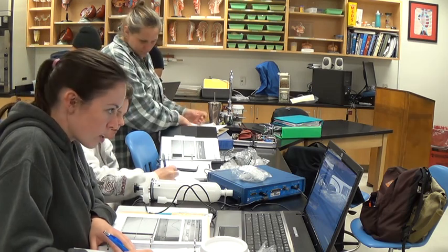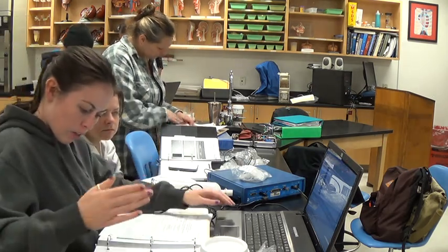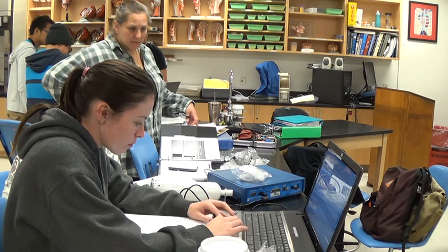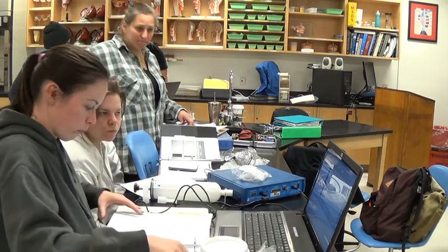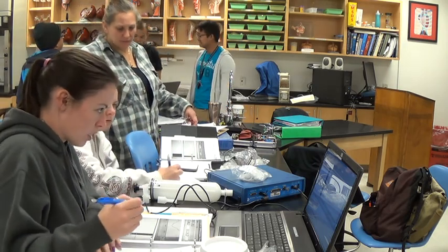Wow. How do you pull up... I did one before we did Olga. They were trying to do that too. You should be able to go into File. See, the other people didn't have redo. Did you save it? Really? Yeah, Trish, they have redo on theirs. I don't know where your redo button was. The redo wasn't there. Oh, redo. I know, you were able to access file before.